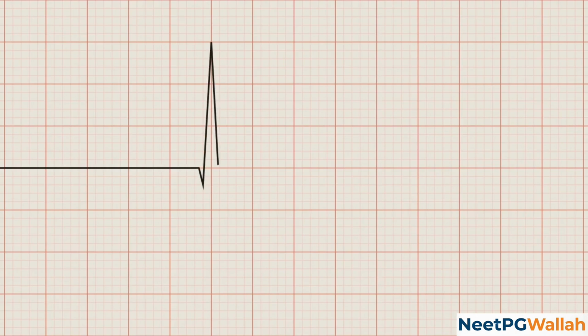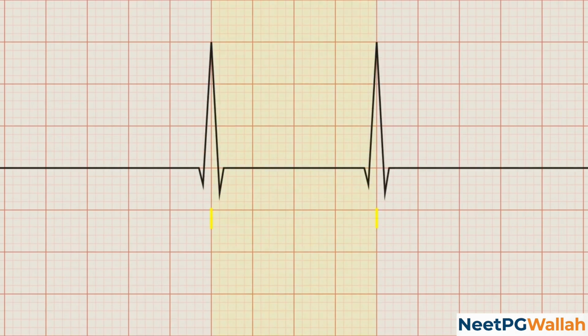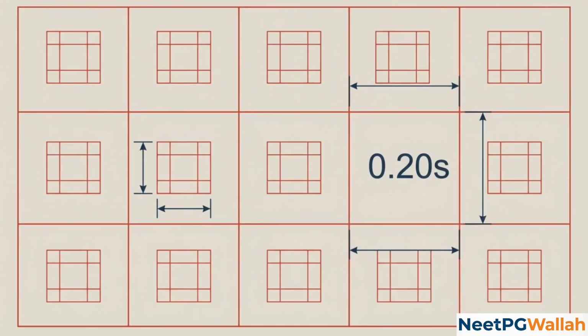To find the heart rate, focus exclusively on the horizontal empty space existing between one spike and the start of the next. Understanding the grid's timescale converts this medical document into a set of measurable geometric intervals.